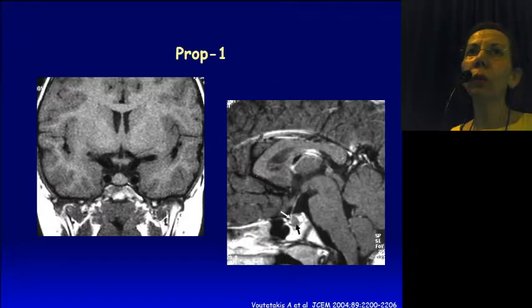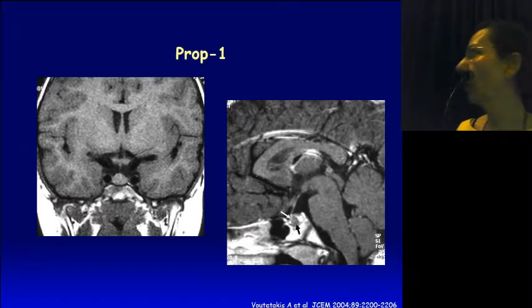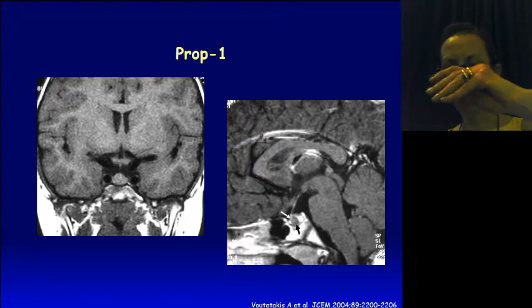It is very important to perform coronal images, and in contrast to adenoma cases, you see that the pituitary stalk is in midline position. This is very important, and here, beautifully, you may see this appearance of the pituitary gland, the posterior lobe bright. This is after contrast administration, the anterior displacement of the pituitary stalk, and you see the anterior lobe, this small thin thing enhancing because the pituitary gland enhances. This is normal. There is no blood-brain barrier. And between the anterior lobe and the posterior lobe, this avascular tissue is the intermediate lobe undergoing regression in those children.